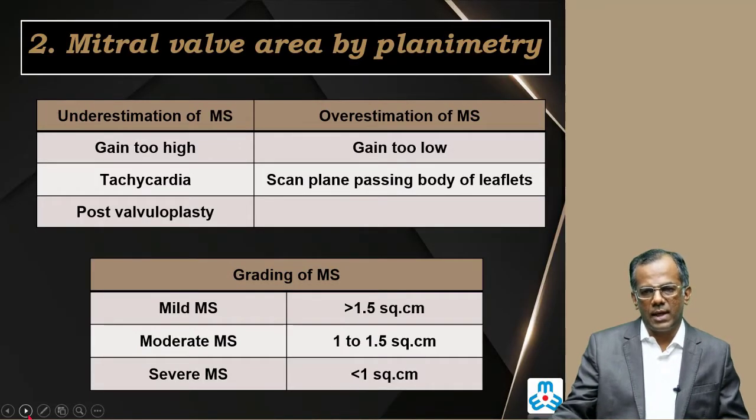Now planimetry also has its fallacies. You can underestimate MS if the gain is too high, if there is tachycardia or in a post-valvuloplasty situation.